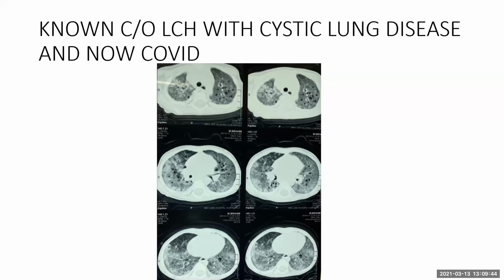It is not so much peripheral. PCP is more perihilar, and PCP in our part of the region is not commonly seen. And this patient had a positive PCR. Of course, differentials are considered, and that is how we rule out and make diagnosis.